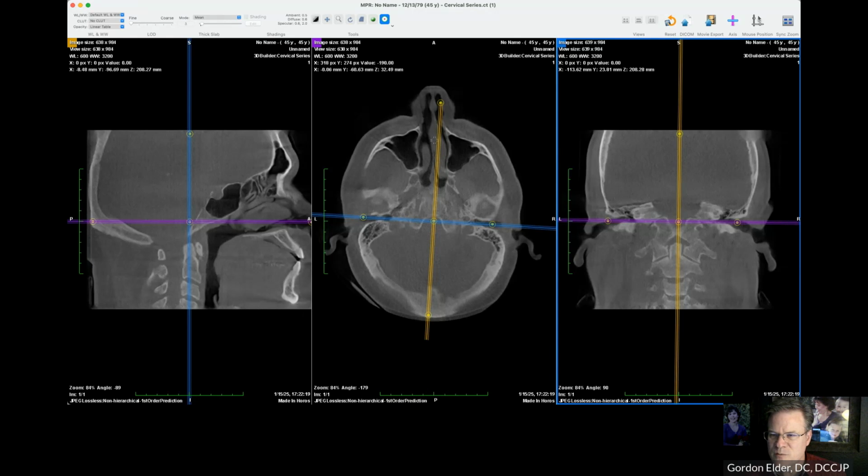So this brings up an interesting point. For this particular guy, the way he's made, this is not a central skull line. So is it his ears on level? Is it the calvarium? Is it the face? I find very often that the face and the calvarium, or the rest of the skull and the facial bones, are not lined up. So you have to be careful what you're going to be using. Ear canal seems to be the best when you put the patient down, if you're going to be using these angles for your adjustment. If you're just trying to find out which direction the bone has moved, maybe it's not quite so important. You're just going to be looking at the joints.